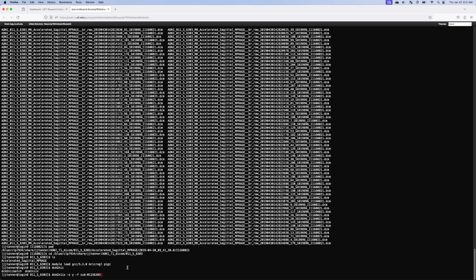Or you could just do the 6303 or whatever the case is. But we're going to put all of that in, and then an underscore, and then you can do what's called a session. So someone might have an MRI, and then they come back 3 months later or 5 years later, and they get another MRI, and that would be a different session.